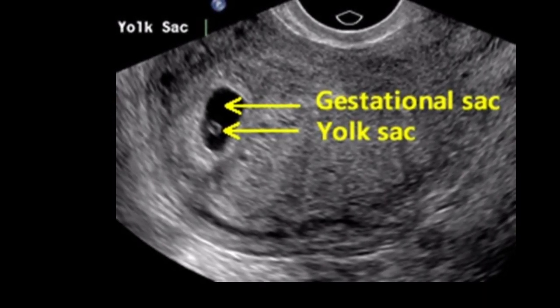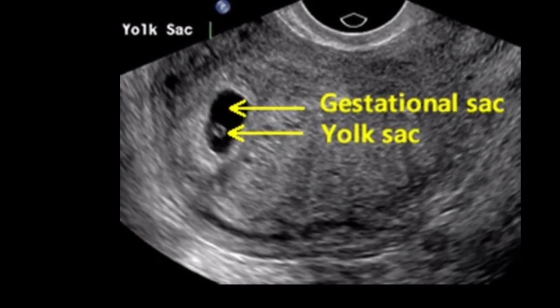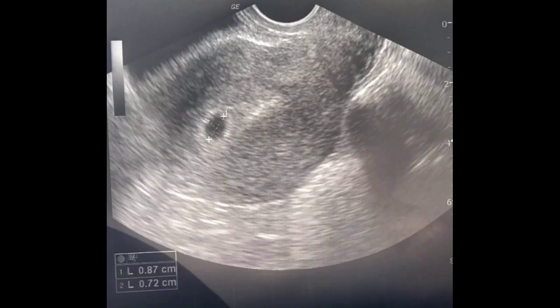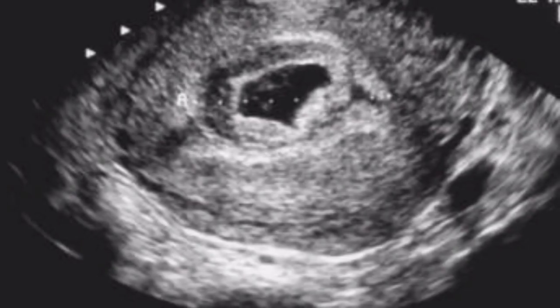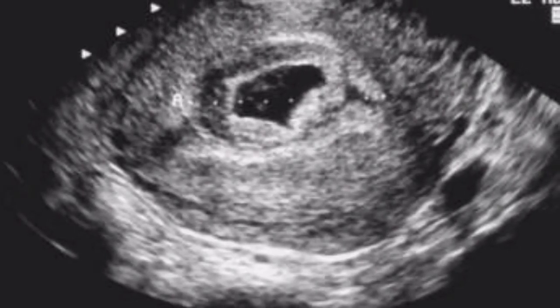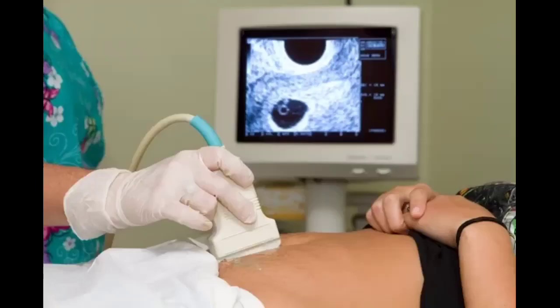However, caution should be exercised with a diagnosis of a pseudo-gestational sac. In a woman with a positive beta-HCG, any intrauterine sac-like fluid collection seen on ultrasound is highly likely to be a gestational sac. An irregular gestational sac, lack of a smooth contour and/or presence of a distorted sac shape is highly suggestive of an abnormal intrauterine pregnancy.